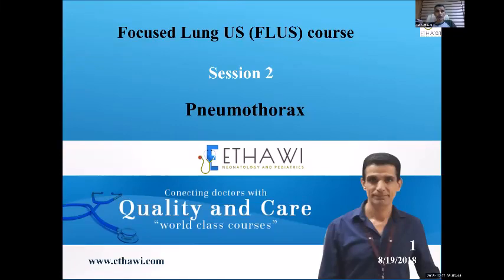Hello. So today we'll be talking about the second session of the Focused Point of Care Ultrasound course, and we'll be talking about pneumothorax. In the first session, we talked about the basic requirements for doing lung ultrasound, including the technique and the A lines and B lines and their difference. And today we'll be concentrating on one pathology, which is the pneumothorax.